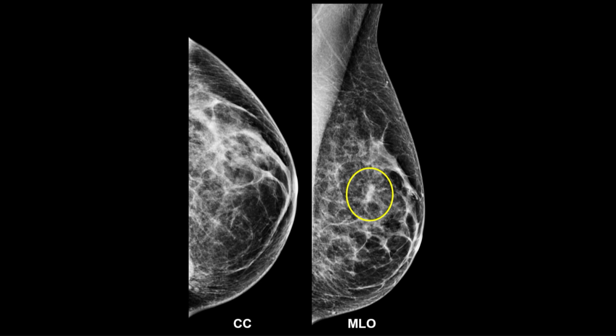Let's say you have a one-view finding and you don't see it at ultrasound. Could it still be a cancer? Yes. Our literature is definitive on that. With developing asymmetries, at least a quarter of them, even though you know they're there and you know where to look for them, are not seen at ultrasound at all. They're totally missed. And that's unacceptable. So you can't use ultrasound to say that something isn't important.